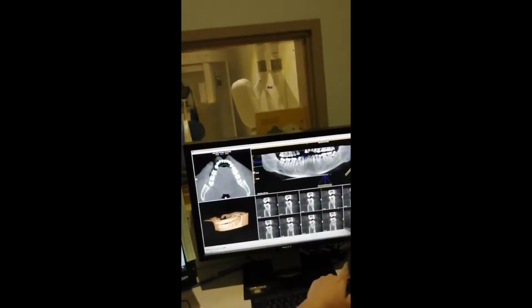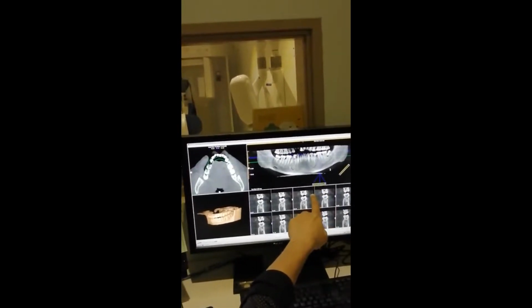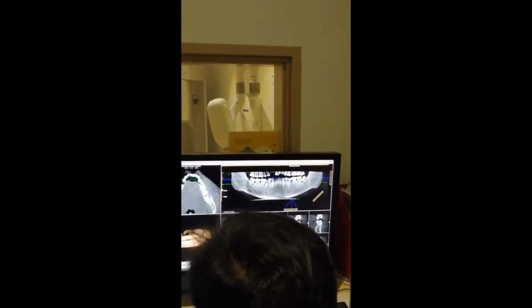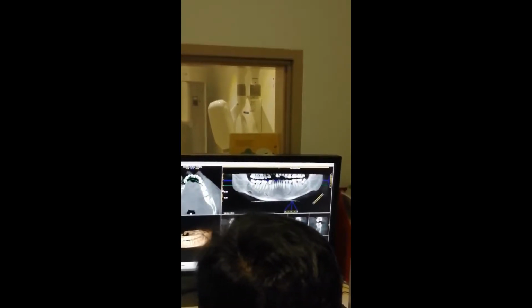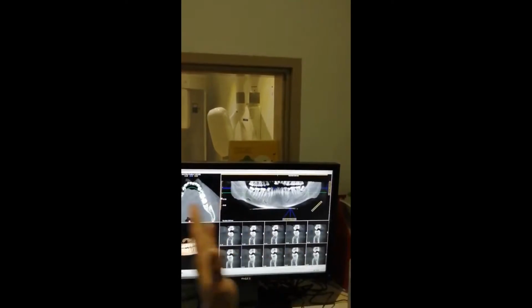Now, if I want to move this front and back, if I do this, it may not be accurate. So I'll keep my cursor here and move it front and back. Now I am having so many windows here. See, it is giving different sections, 31.25, 50, 75, meaning a little bit back and front from the app here.